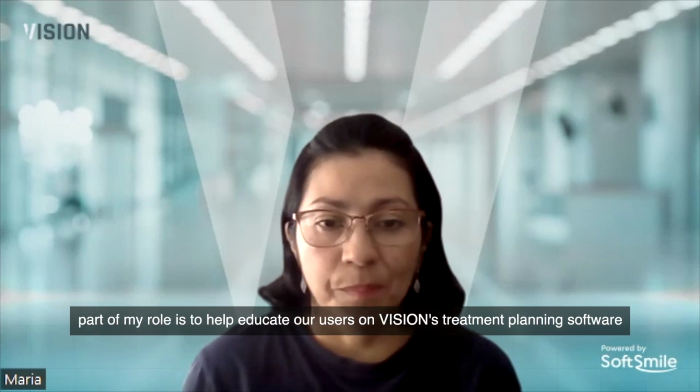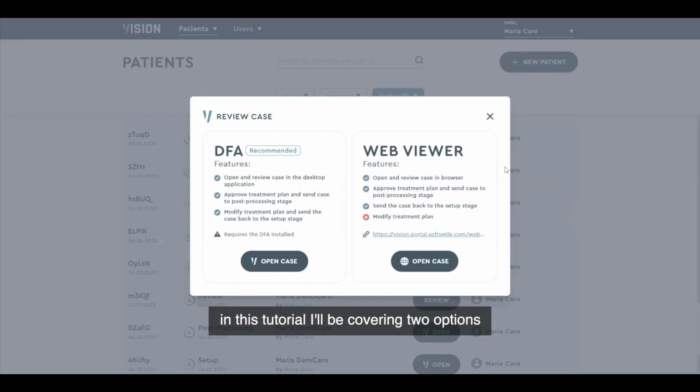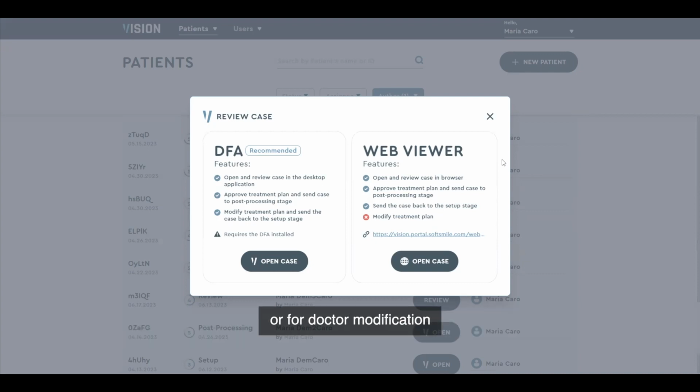Part of my role is to help educate our users on Vision's treatment planning software. In this tutorial, I will be covering two options that a case can be reviewed after a treatment plan has been created and sent for doctor approval or for doctor modification. Option one is DFA, or Doctor Face app.